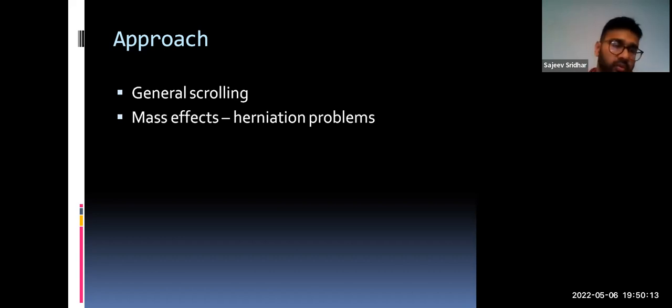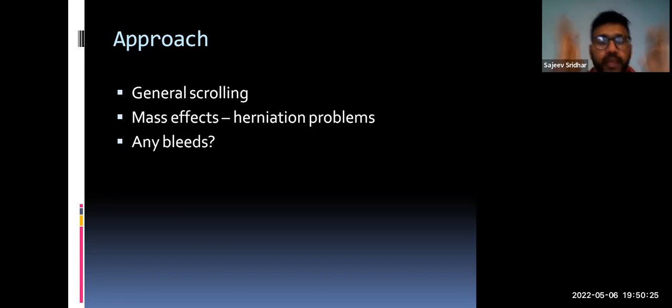Next thing that you need to rule out: any bleeds. Now, as I mentioned, bleeding is kind of complicated when we're dealing with the brain, because you're dealing with several different components of bleeding itself, because you have different timelines. We have the hyperacute bleed, we have the acute bleed, we have the subacute bleed, and then we have the chronic bleed.